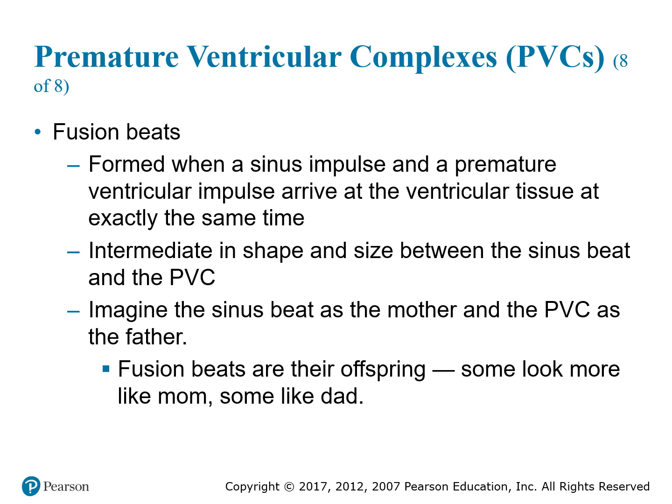They resemble true ventricular beats. Some fusion beats will look more like the sinus beat, just a little wider or taller or deeper, and others will look more like the PVC but narrower. Fusion beats are caused by the same factor that causes PVCs and are treated the same way.